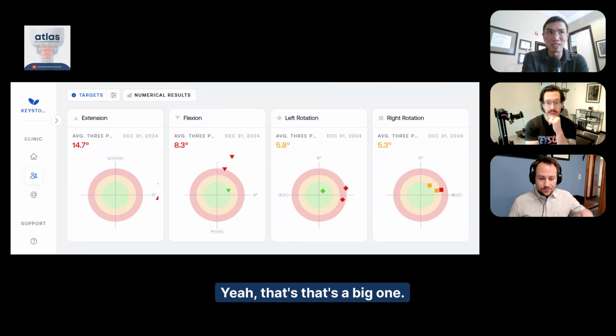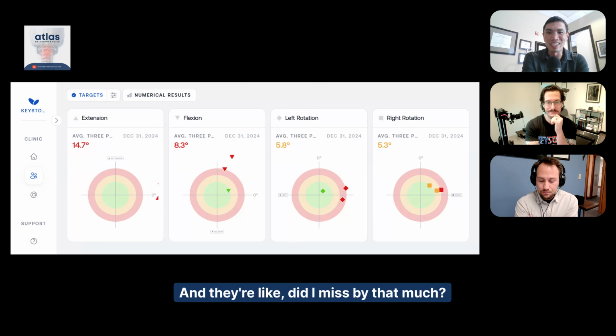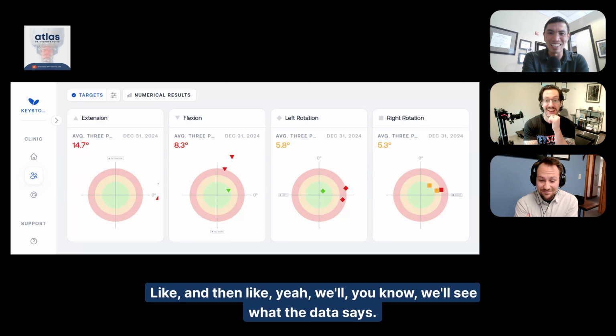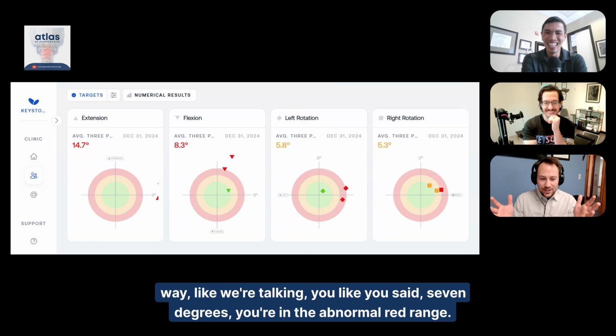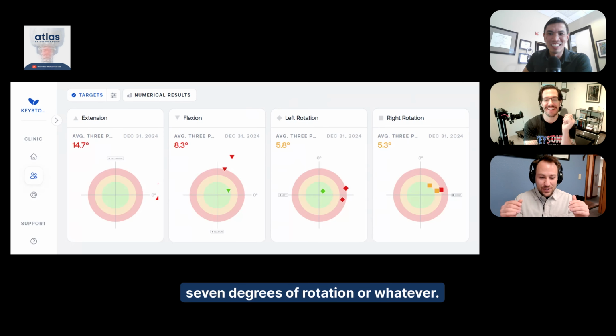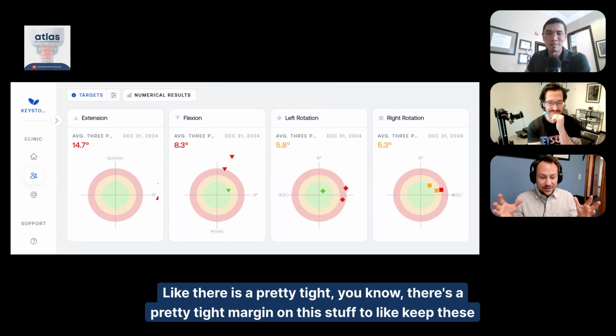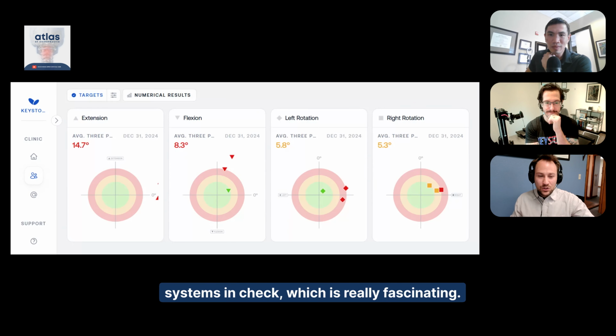100%. That's a big one, because that's the most frequent comment that patients will give. They say, "Did I miss by that much?" And we say, "Well, we'll see what the data says." By the way, we're talking about, like you said, 7 degrees, and you're in the abnormal red range. That's not a tremendous amount of degrees. You ortho people would freak out about 7 degrees of rotation or whatever. But in the human frame, we're talking about 7 degrees. There is a pretty tight margin on this stuff to keep these systems in check, which is really fascinating.